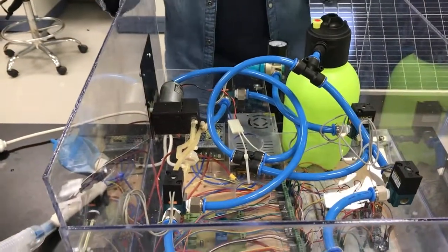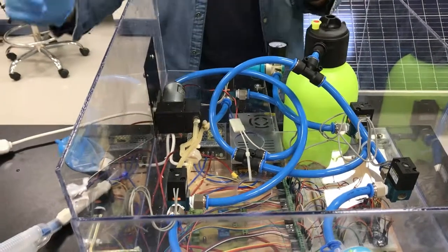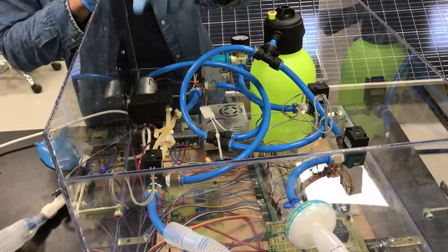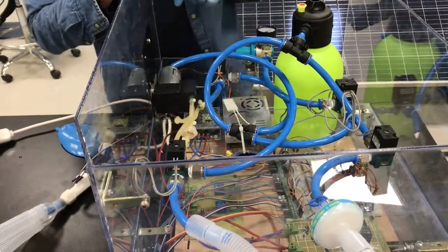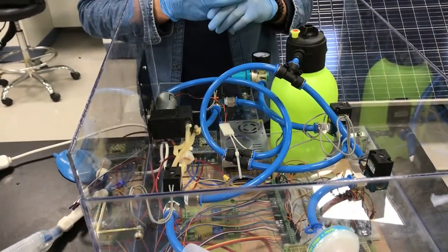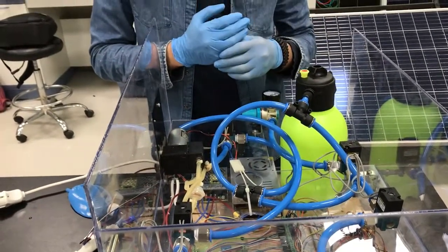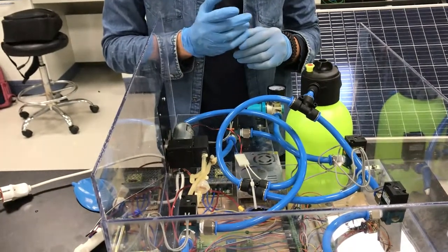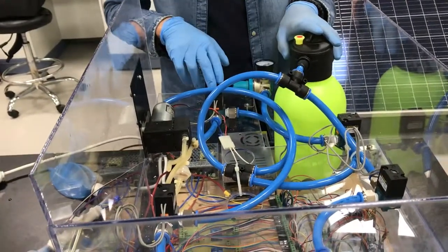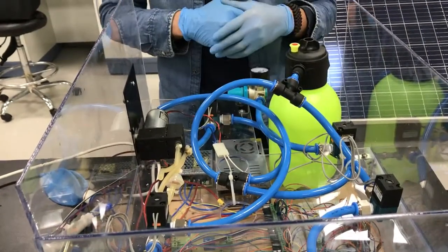In our model, the doctor gets to put 4 inputs. The inspiratory pressure controlled by this inspiratory valve, and the expiratory pressure controlled by this expiratory valve, and the respiratory rate and E to I ratio, which can also be controlled by the frequency of the valve and the duty of its opening and closing. And finally, the concentration in this tank, which you can control by the valves before the tank for the oxygen and the air together.